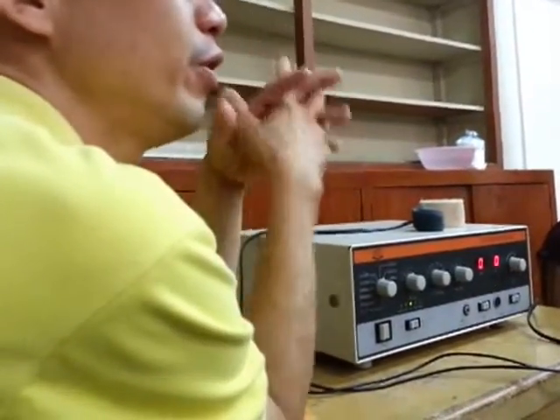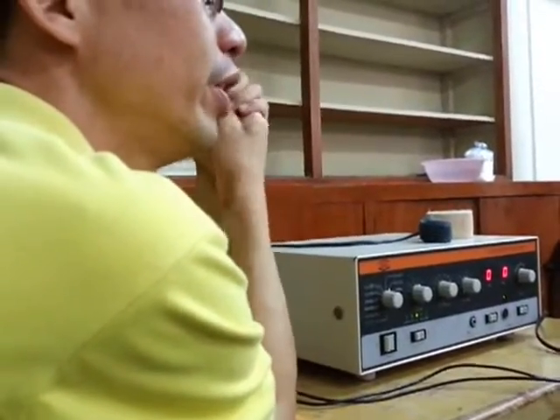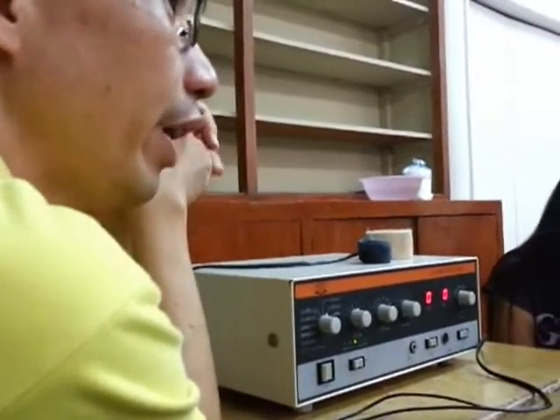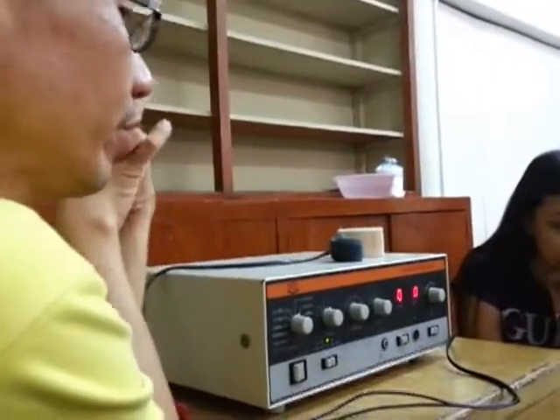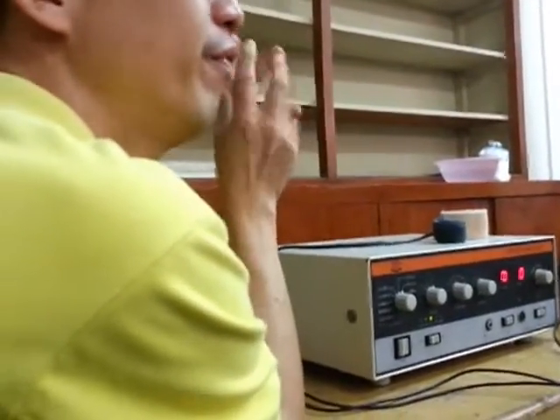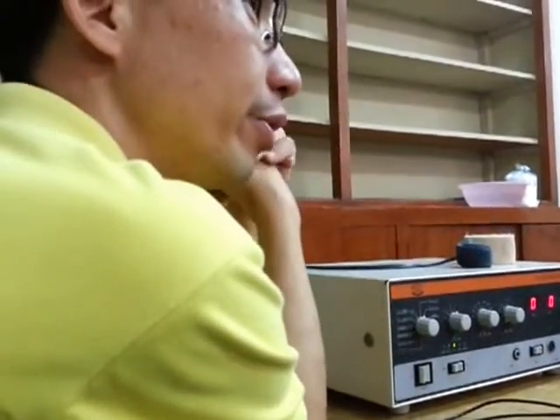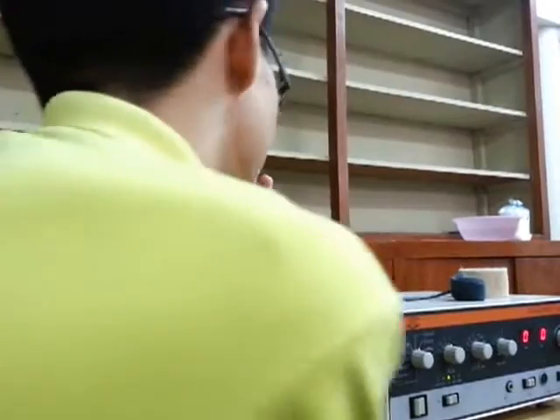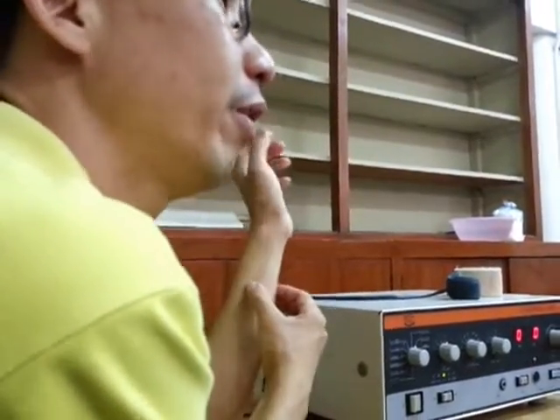Okay, why do we tend to use a longer pulse duration for denervated muscle? Since in denervated muscle you don't have any nerve supply, once a current is applied to the structure, it is not sensitive, because there is no nerve supply. So if you apply the current only briefly, the tendency is the muscle will not be stimulated since there is no nerve.